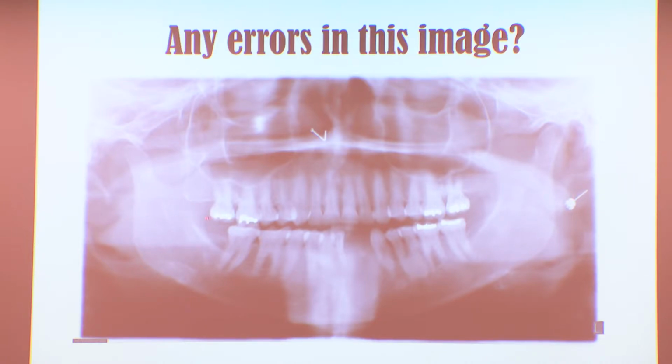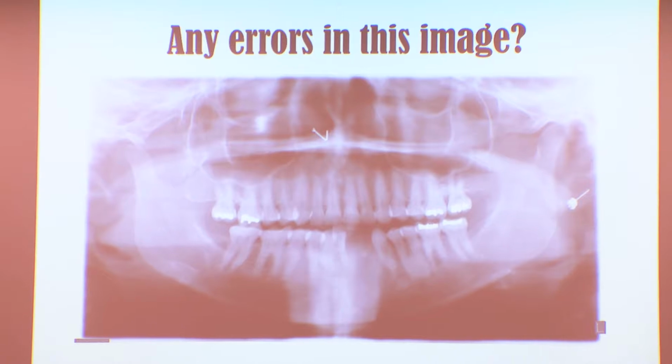Rotation. So the right mandibular body looks larger than the left. So where's the ghost of the earring? That's what I was wondering. Up over there, that blob there. Yeah. And why isn't there a ghost for the nose ring? It's close enough to the midline. It's not going to send a ghost off.